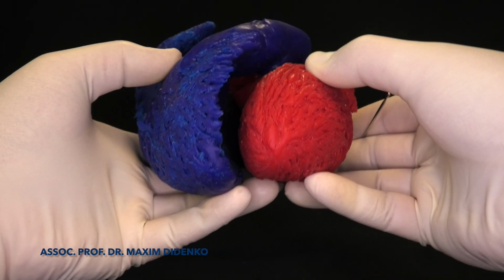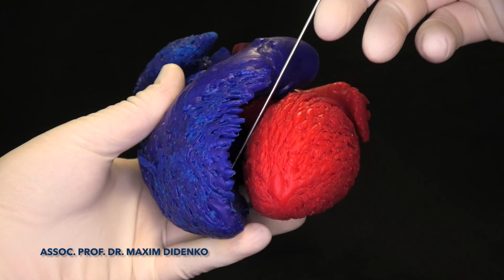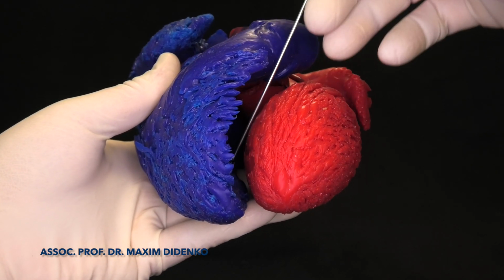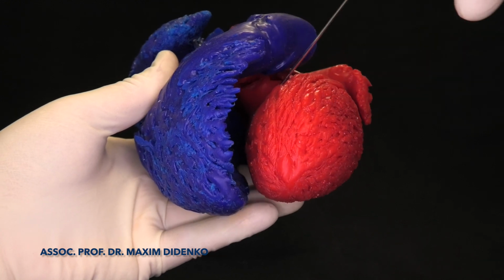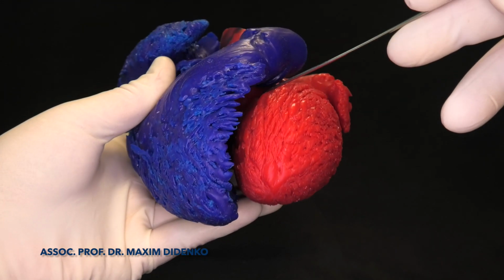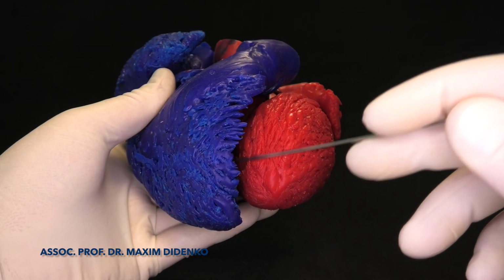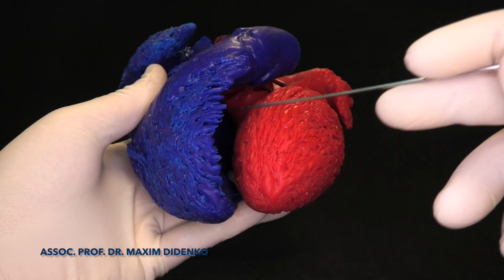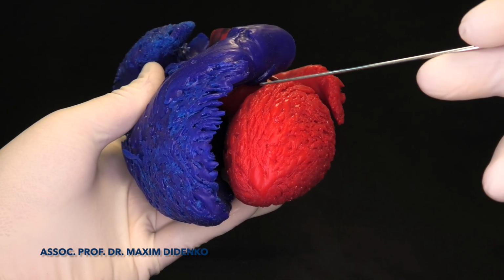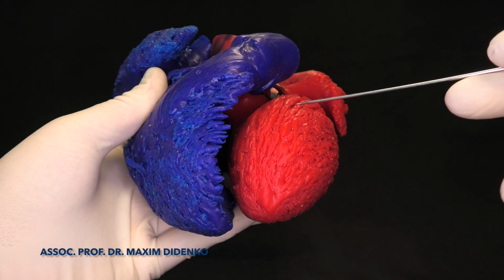Already now what we can see is that the septum pretty often can be found in anatomical books as just a straight structure, but you can see already here, especially in the endocast, that it has a semilunar form. The right ventricle septum somehow surrounds the left ventricle.